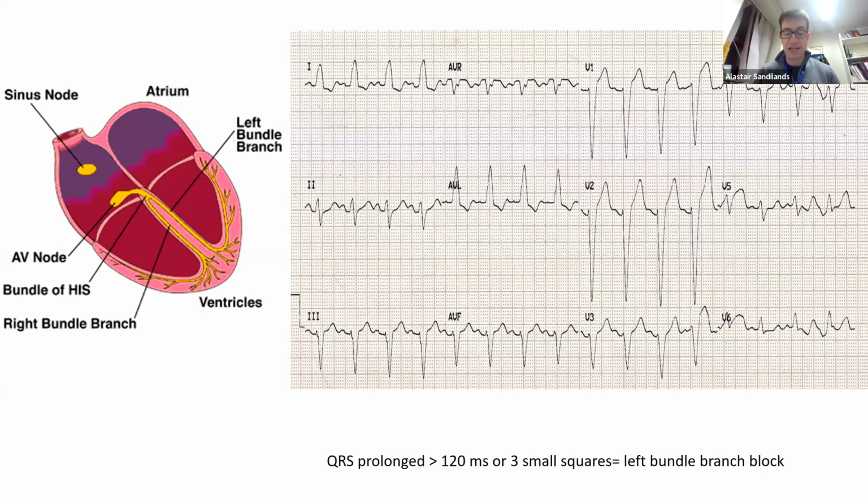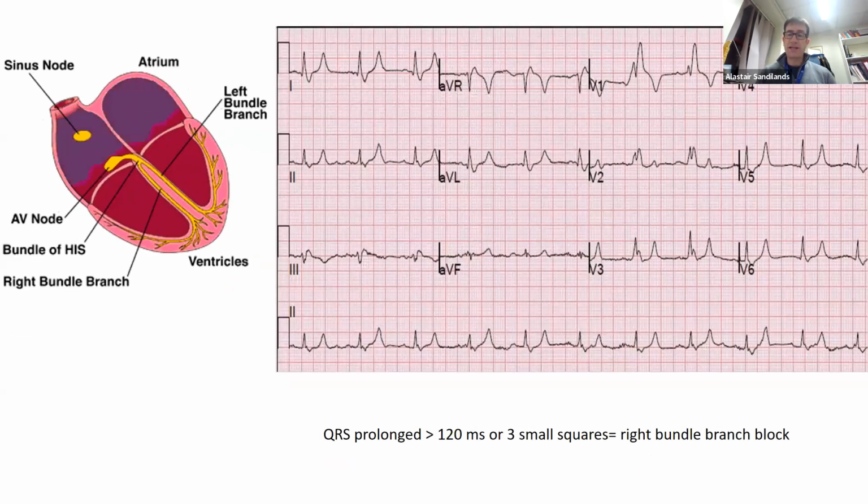That becomes more pertinent next week when we do those ECGs of broad complex tachycardia, but it's just showing you. Alternatively, the ECG may show another QRS that's prolonged. So we go to V1, yes, it's very prolonged, greater than 3 small squares. The deflection now of the QRS goes above the isoelectric line. There's the isoelectric line. And in particular in V1, there's these bunny rabbit's ears.